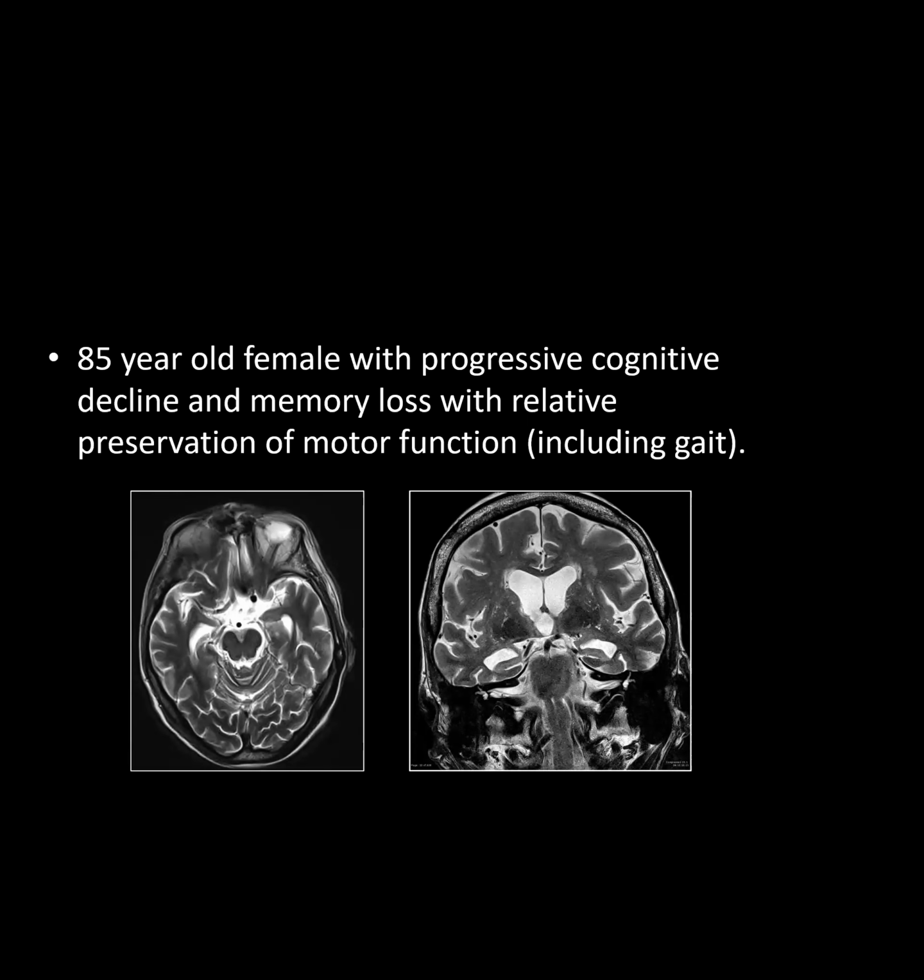So, I'm not so sure, but Zhang by my side is saying it's frontotemporal dementia, and there's significant atrophy of the hippocampus and also enlarged ventricles compared to the normal. So I guess the frontotemporal part is more atrophic than the occipital. Right. So there's generalized brain atrophy, especially hippocampal volume loss.